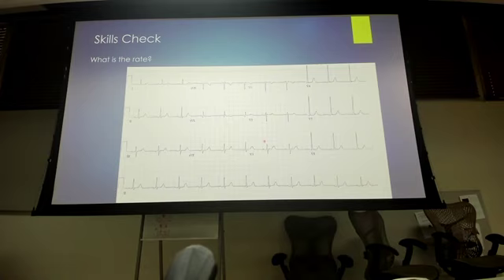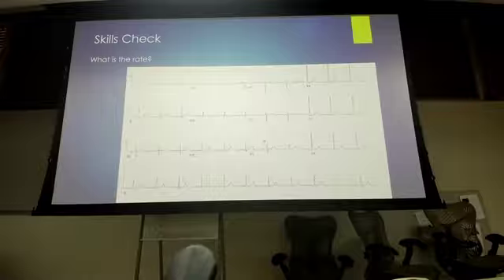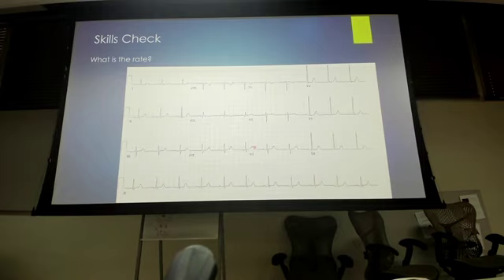And what do we have here for our rate? 66, ma'am. 66, how do you know that? Because it's a 10-second strip, so you multiply the R's times 6. How did you already look at this? You were looking ahead? 66, you said? Yes, ma'am. How many R's are on the strip? 11, ma'am. 11 times 6. Yeah, 66.